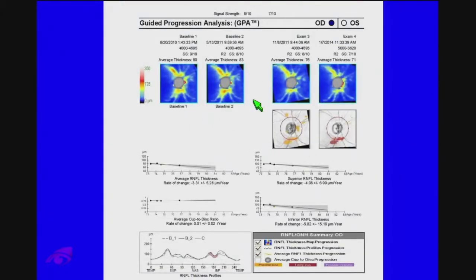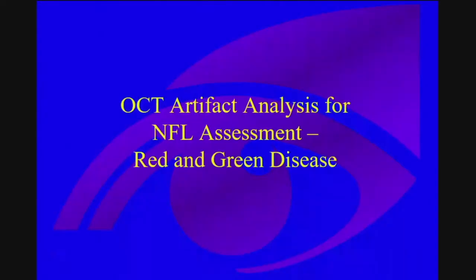And as Joel pointed out, and Joel did a really great job to tee everything up for me, even though we didn't collaborate on this, the glaucoma progression, I used to do this manually, but now with the Cirrus and other programs, you can actually get that information all at once, and I think it's very important that we do that on a regular basis.